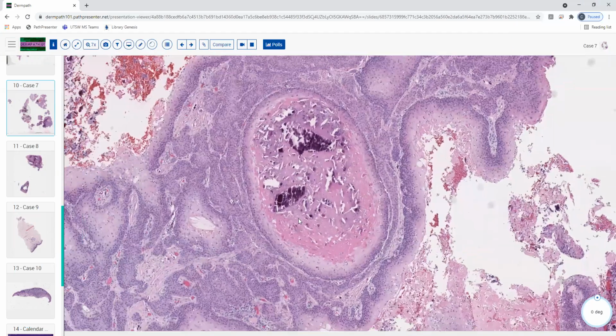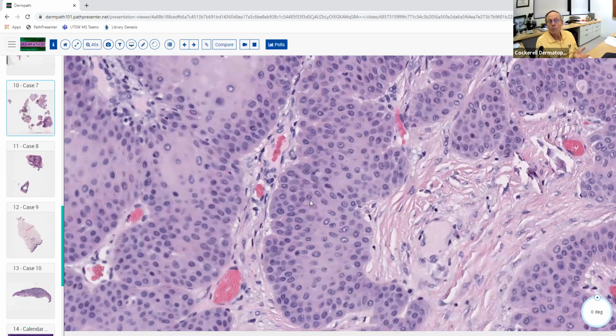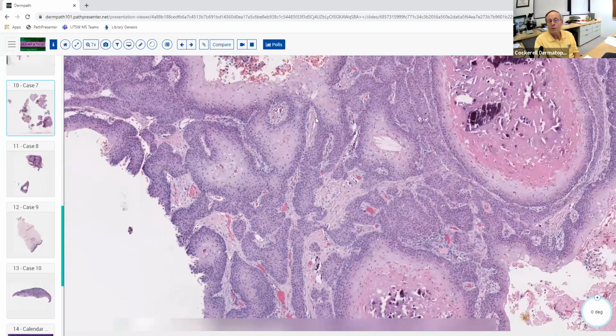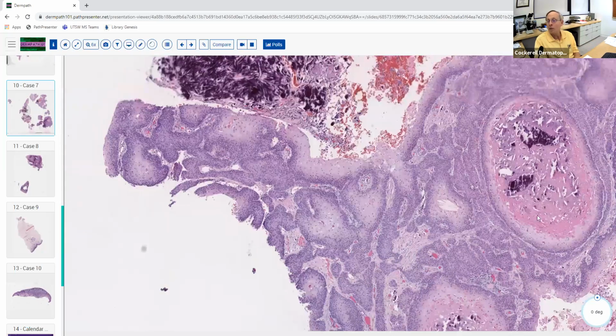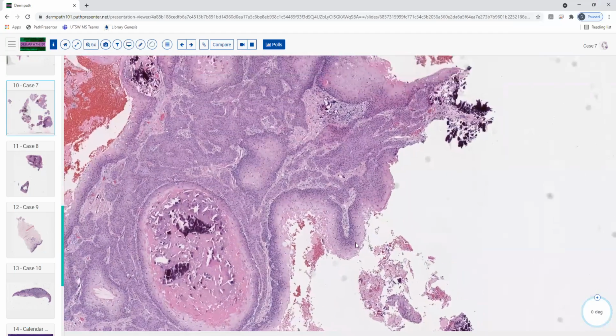So if this is a large lesion, if this was a squamous cell carcinoma, for example, wouldn't we expect to see some pretty atypical cells if something got this big by neoplasia that was malignant? So the answer is yes. We don't see that here. So when you don't have the ability to always apply architecture, you have to then use secondary features. So there's really no atypia, there's no mitoses. So this is almost certainly benign, even though it's large.